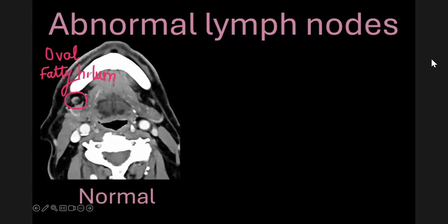A normal lymph node is going to be oval. Here's a very normal looking lymph node. These lymph nodes are usually oval in shape. You can call them reniform, kidney shaped, whatever. So these are oval, and they usually have this.